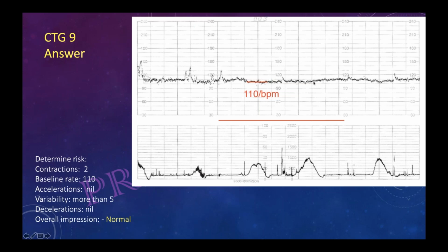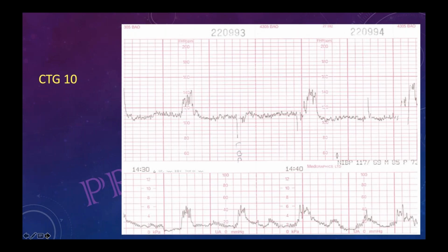Half a box is there. And even after the last contraction there is one box, more than half. I think it is normal. Okay, who is next?